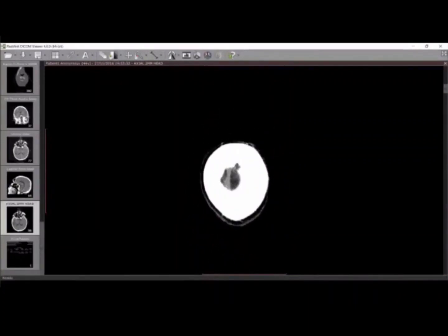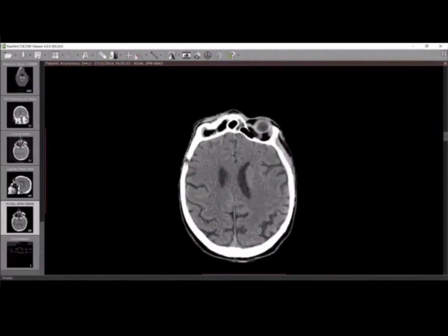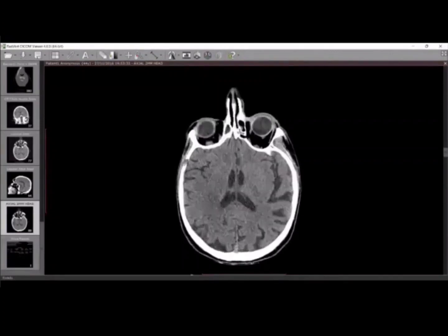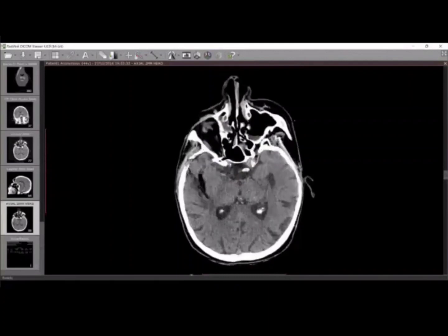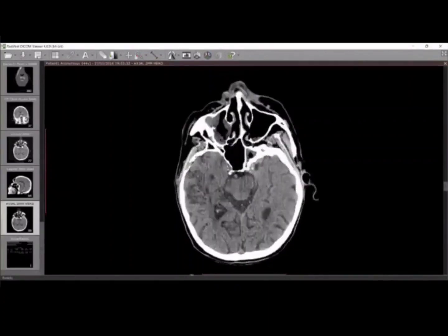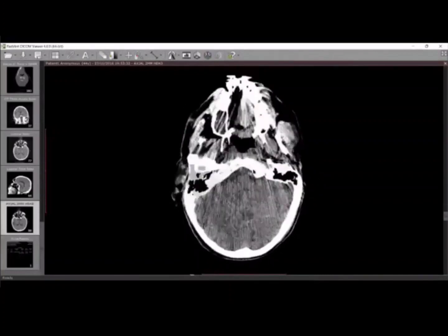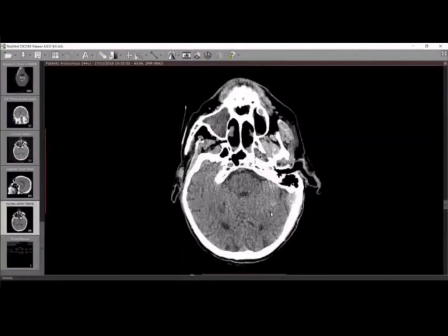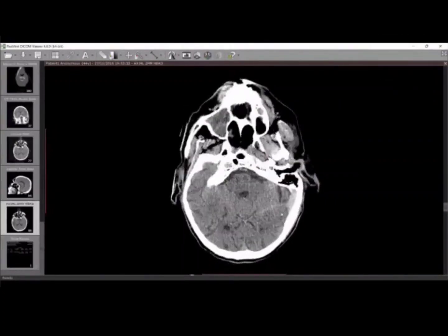Okay, so this is a patient with trauma. In this patient, I'm looking for any intraventricular, intraparenchymal, subarachnoid, or extradural hemorrhages. When I was scrolling in the posterior fossa along the tentorium on the left side, can you see my mouse, sir? Yeah. When I'm comparing the tentorial leaflets on both sides, I feel that the left side is a bit hyperdense. Don't worry about this.